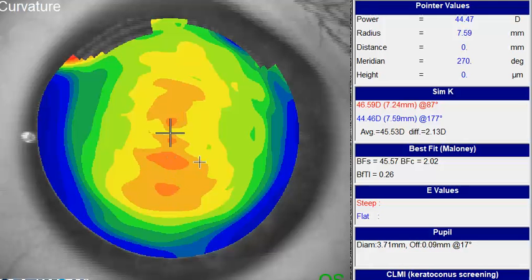If you average the cornea when you first open up the software, sometimes it will make this a little bit more uniform through here, which can sometimes throw the fit off a hint. So sometimes if you have a nice looking topography like this, I'll choose not to average out the astigmatism. That'll give you a little bit more true corneal data to help in fitting.